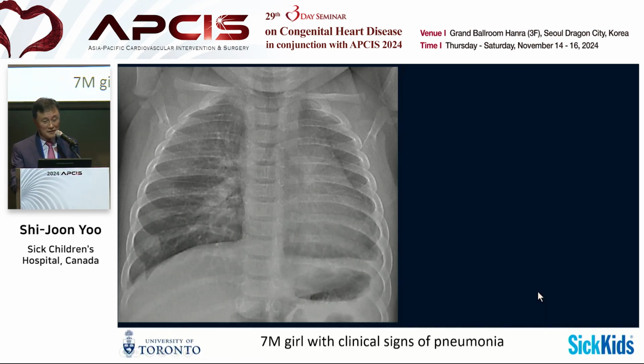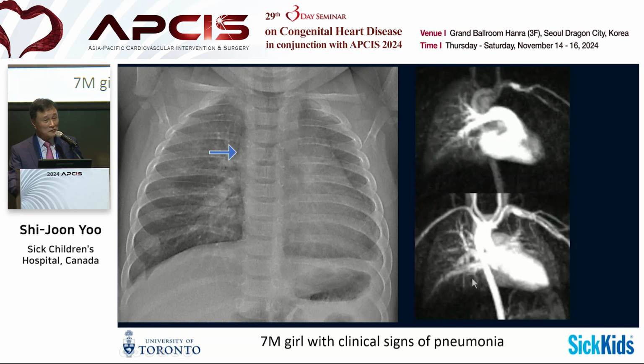However, in this case, if you look at the chest X-ray very carefully, the left lung is hypoplastic. How do I know? Lung volume is small and the trachea is displaced to the left side. And then there is one more finding. Can you see this one here? So the descending aorta is on the right side, which means that this should have a right aortic arch. In the presence of a right aortic arch with the small left lung, this is the diagnosis.